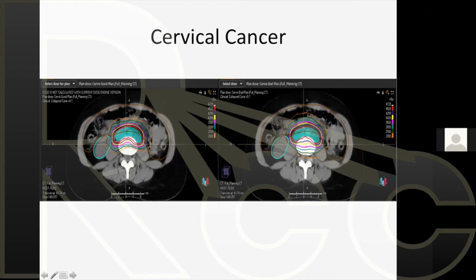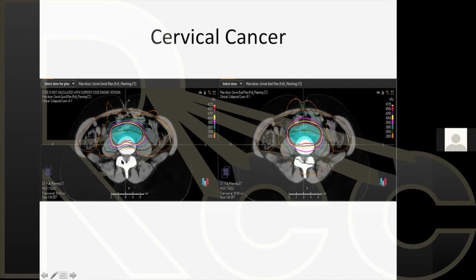So what are we worried about? What normal tissues? You're going to worry about the kidney. You're going to worry about small bowel. You're going to worry about spinal cord. So as we go down, what are we looking at? We're going to give 45 gray to all of my CTV, as we talked about, plus PTV. So the blue color wash is your CTV plus your PTV, okay?